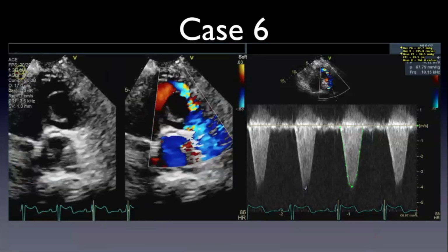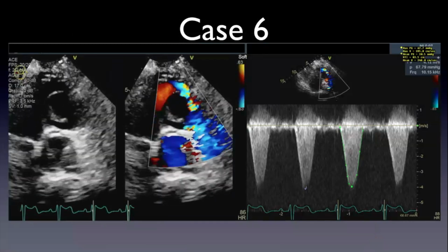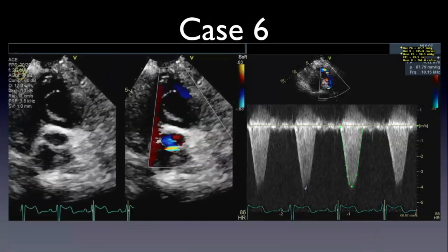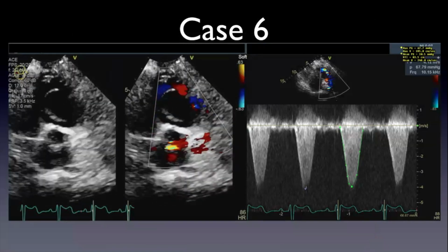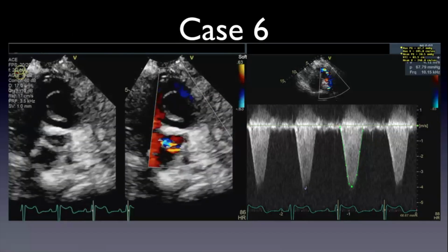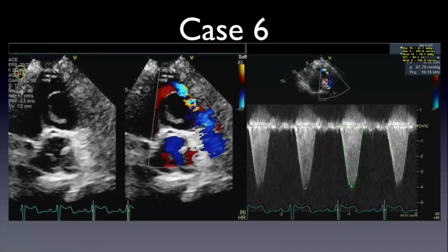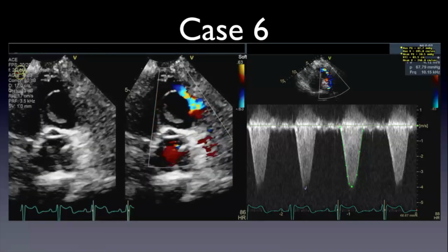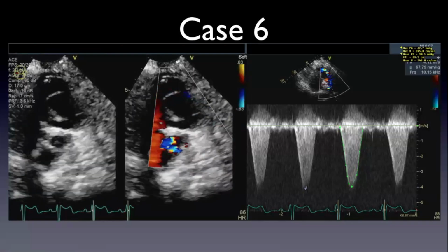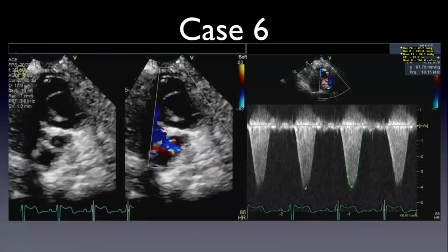So this test is if you can identify the view and what you're looking at. So we're at the parasternal short axis, at the aortic valve level. We're at the base. The aortic valve looks as expected, it's opening well. Then in the RV, you see the rounded linear structure there, and the color flow seems to respect it. It's like going around it there. Which is huge. Yes, definitely.